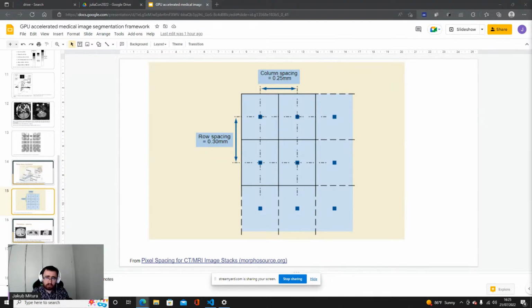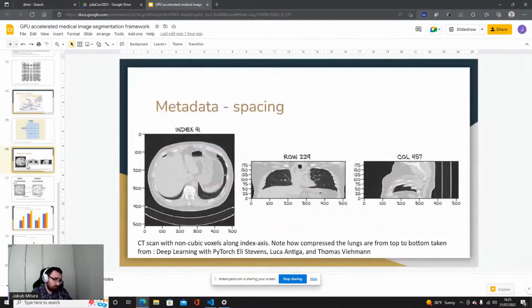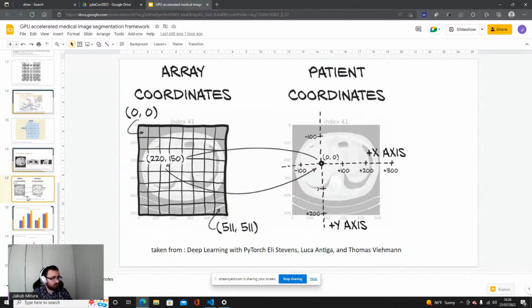optical distortions. Yes, it's good to check whether there are some artifacts or not. Yes, and some information about the artifacts is also important from the perspective of the metadata. Yeah, very good. Okay, so this is the example. You would see it on my viewer, basically. How it does not look, yes? If you imagine the lungs that you have on your own, it's not so compact, yes? So it's wrong metadata, but I will not delve into it. You will see it later.